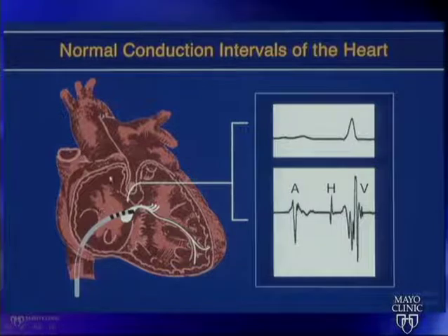So local electrograms: if you have this catheter in the atrium, you'll get a local atrial electrogram. It's like a local P wave. If the same catheter moves into the ventricle, you'll get a ventricular electrogram, which is like a local QRS complex. Now, if you put this catheter where the His bundle lives, somewhere near the annulus, you will record both atrial and ventricular electrograms.